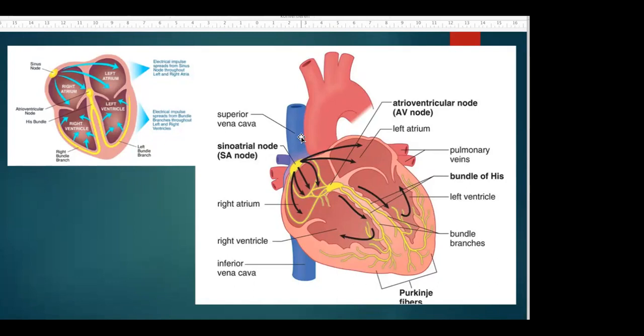A 60-year-old female patient comes to your emergency sector with a pulse of 35 BPM. Just feels a bit dizzy, but is doing fine. All of the other exams are fine. What do you do with the patient? Look at the ECG. You see they have an AV block type 2B. How do you proceed with this patient?